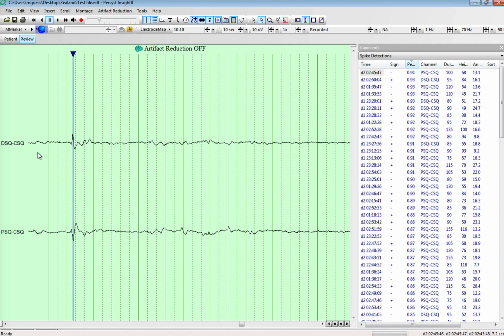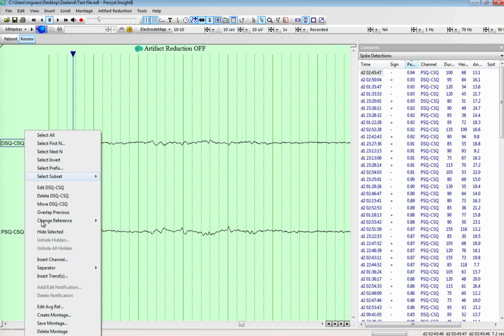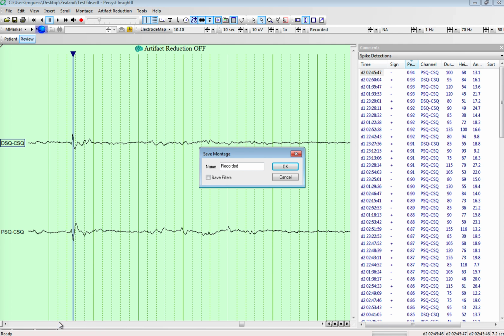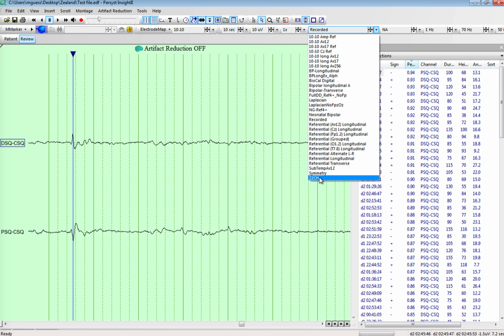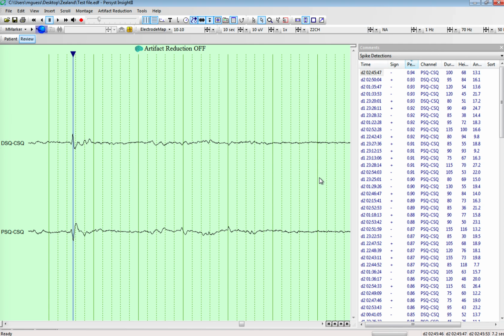So once we select the recorded montage, then we can save this as a montage we can use for review and for performing the spike detection. Let's go ahead and select Save Montage. This is where you'd put in the name. I've already done that, and I saved it as Z2CH, two-channel.